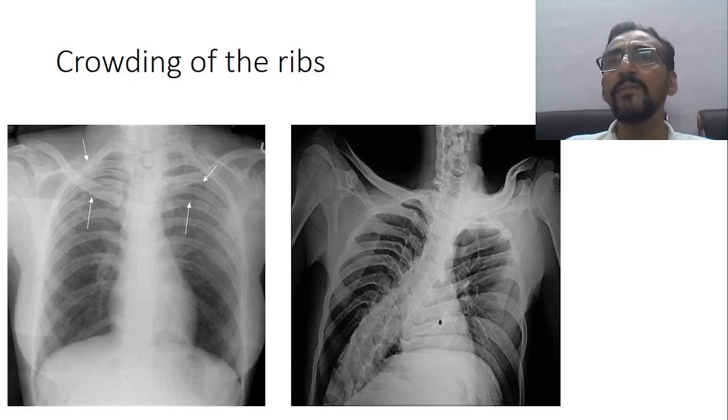Very simple. If it is horizontal, more and more horizontal, it suggests that volume overload is there, like emphysema. Or sometimes ribs become more and more horizontal even in case of rickets. Okay, rickets and some other bony deficiency problems. Like in rickets, there will be straightening of the ribs. That's also called a rachitic chest or long flat chest.